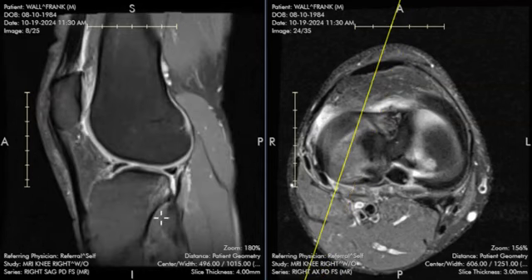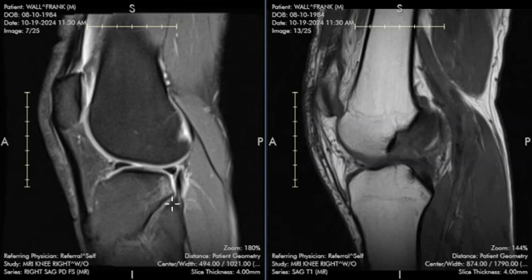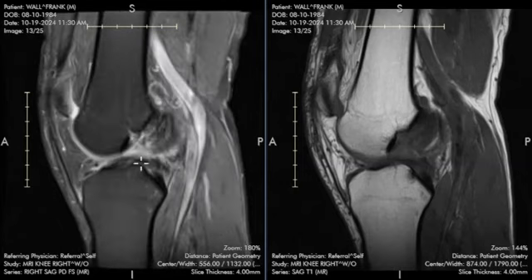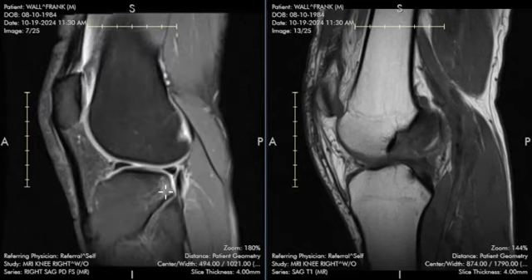Next, I noticed that there is a moderate bone contusion at the posterior aspect of the lateral tibial plateau. So this is consistent with transient dislocation of your knee at the time of your injury. The ACL typically runs from here to here, and it's usually tight. It's a principal stabilizing ligament of the knee. When it tears, it allows your distal femur here to jump back where it can impact the posterior portion of the tibial plateau, seen here.